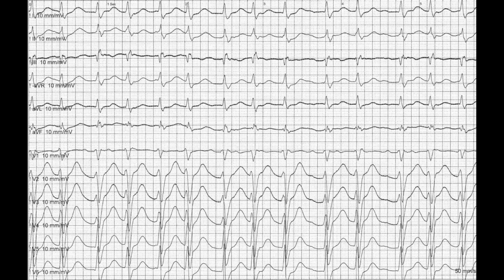This ECG shows an irregular rhythm with a rapid ventricular response. One might assume that this rhythm is caused by atrial fibrillation because of the irregularity. However, careful inspection of this ECG shows that there is a regular atrial activity best seen in lead V1 with decremental conduction properties and resulting block of atrial activity.